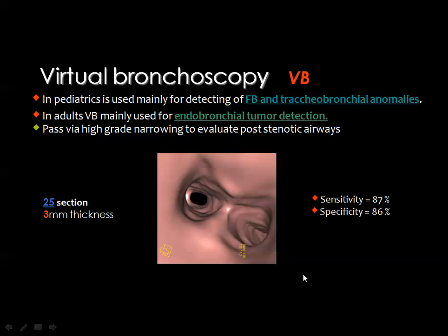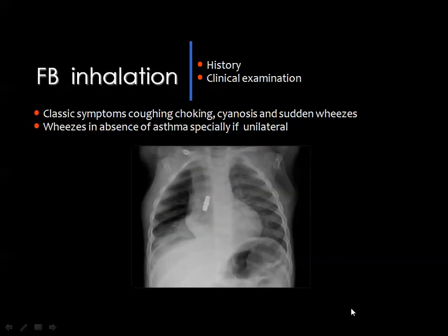And you should remember that virtual endoscope cannot diagnose any of the dynamic lesions like tracheobronchomalacia, for example, but these are static images that can help you to look inside the trachea. And the major two advantages are, in children, to detect an inhaled foreign body which is not detected by the regular endoscope, and in adults, to see the invasion of the bronchi by the bronchogenic carcinoma.